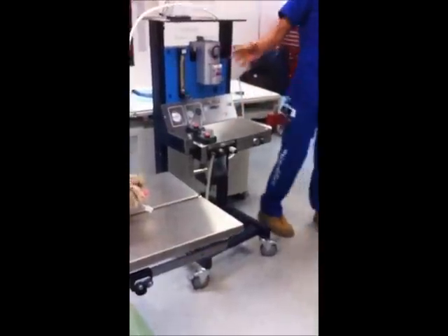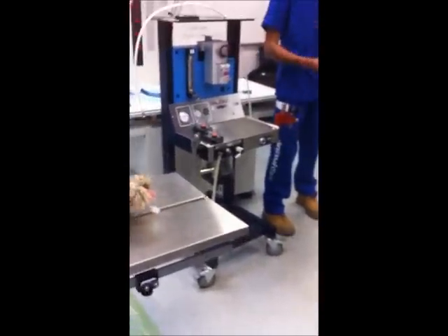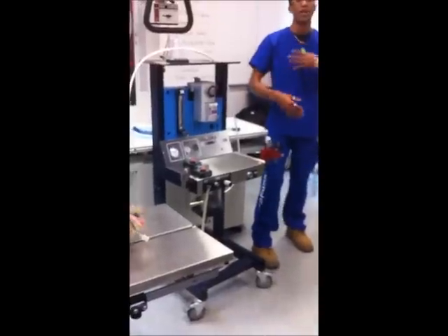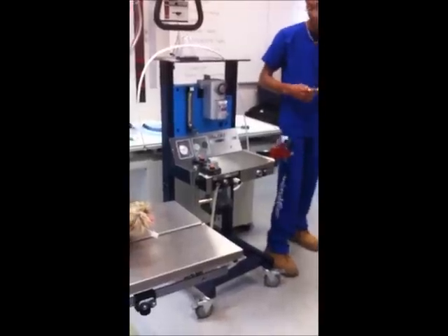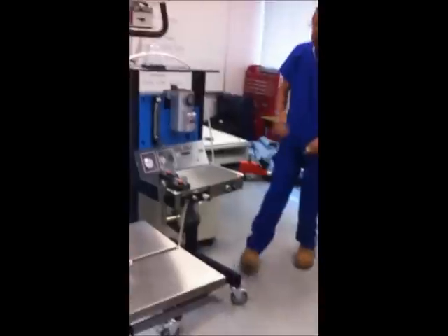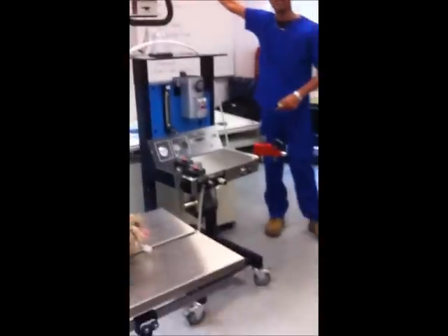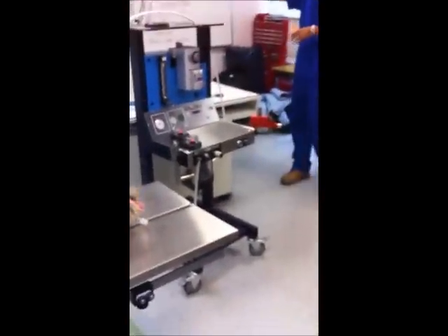Again, because this is the rebreathing system, it filters as much as it can, so it can reuse some of the anesthetic gas that came out or some of the oxygen that came out, and that is refiltered back to the animal. However, with the non-rebreathing system, what the animal breathes out is coming straight out the scavenger and out of the system. As you can see on my little schematic, I have some pigeons on the side.